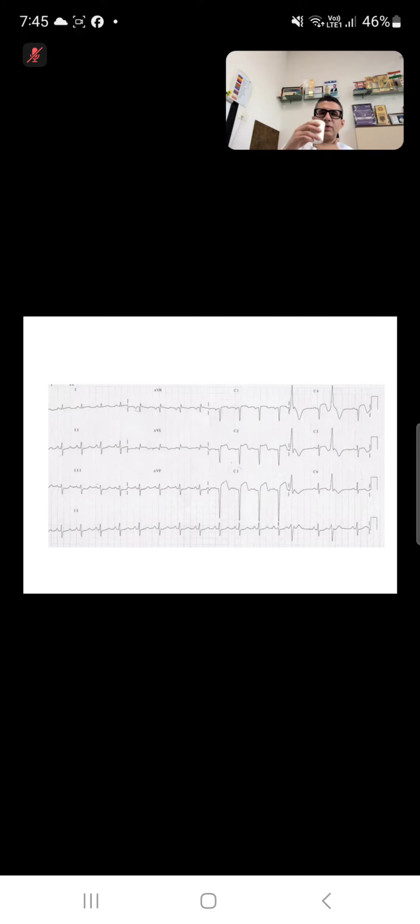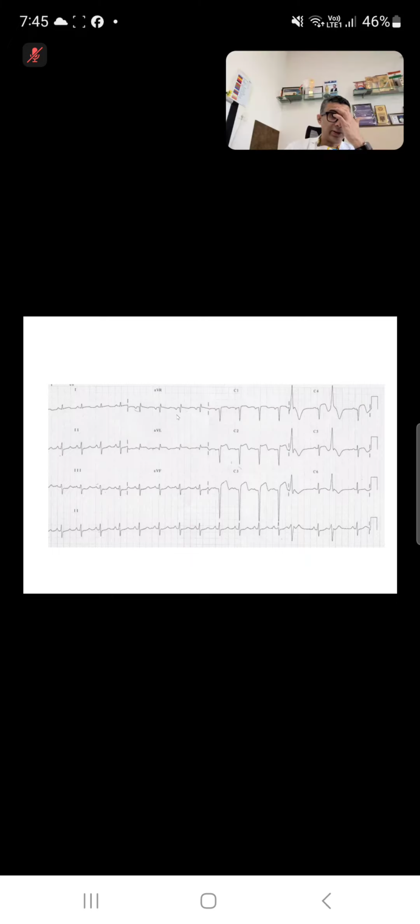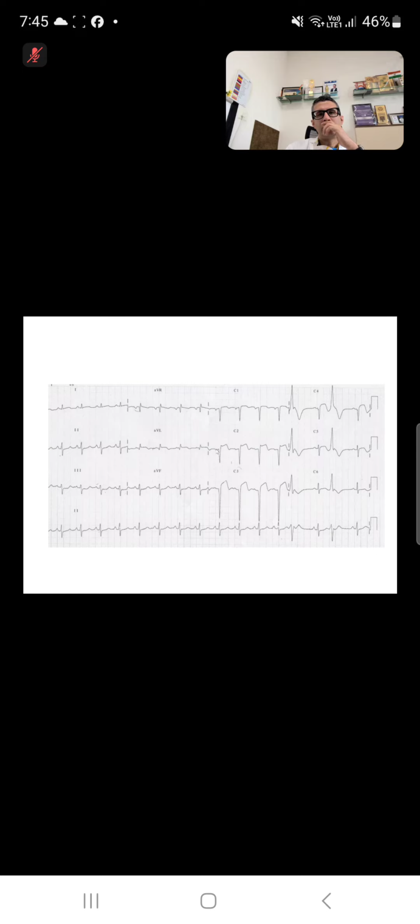Coming to the diagnosis, sir. We have not finished reading the ECG. Is anything else abnormal? aVR is positive, sir. aVR is not positive, aVR is negative. Not net positive, but it's slightly positive. That's okay. This is LVH, sir.